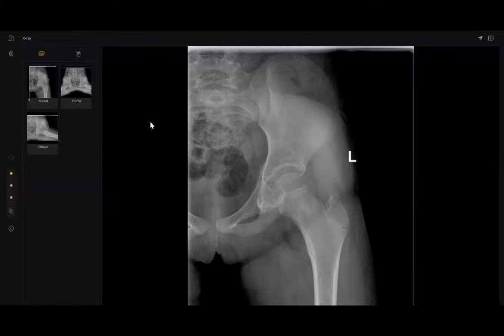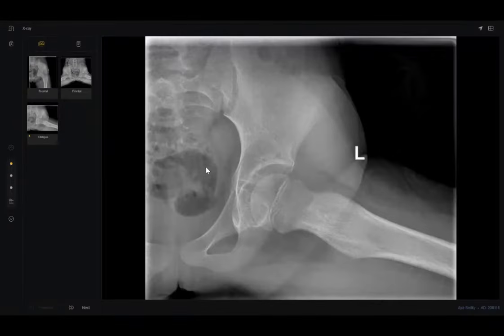So I am thinking of any fracture, any avulsion fracture at the trochanteric region and also at the femoral head. There is no definite soft tissue component or periosteal reaction. There is no definite periosteal reaction in the femur. So I would further want a lateral view or the rest of the views for the evaluation.